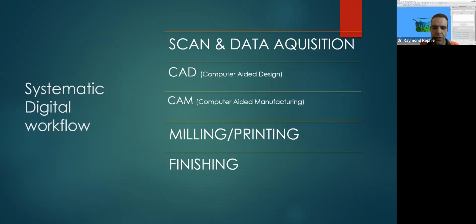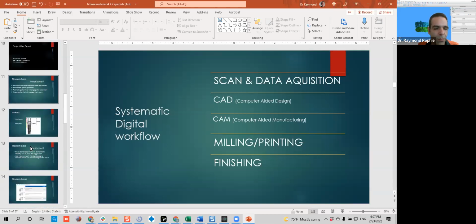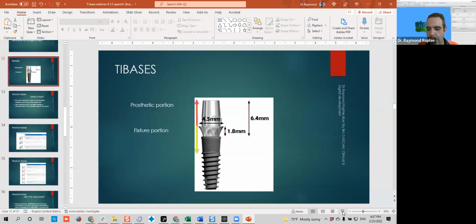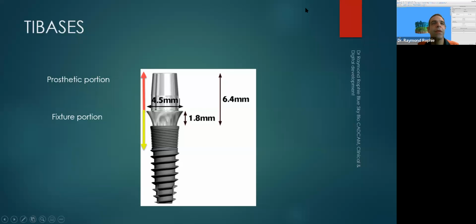Okay, so we will be designing a crown, a full restoration, supported by a titanium base. So there you go. I know that everybody knows these are the regular BlueSkyBio Sky base or any Ti bases. These are CEREC compatible as well.